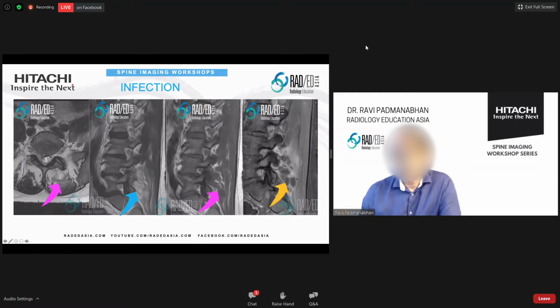But when we give contrast, what you see is that you've got these multiple cystic structures which are not enhancing. So these are the cysts and abscesses around the infected facet joint. And this is the inflammatory and infective change within the adjacent soft tissue. So we talked earlier about infective or inflammatory changes within the cyst.